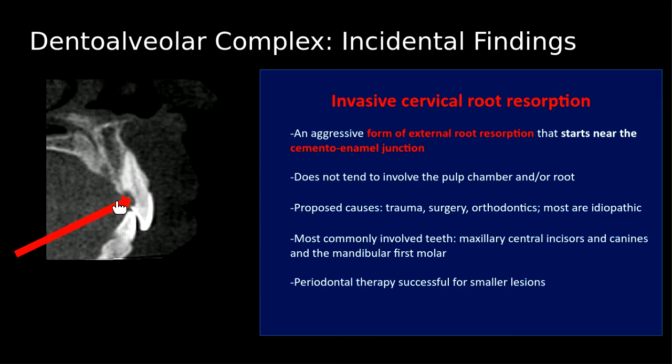So this is a form of external root resorption, and there's a specific name for this. This is called invasive cervical root resorption. They believe it's probably because of trauma, previous surgery, or orthodontic therapy. This is a very interesting type of external root resorption.